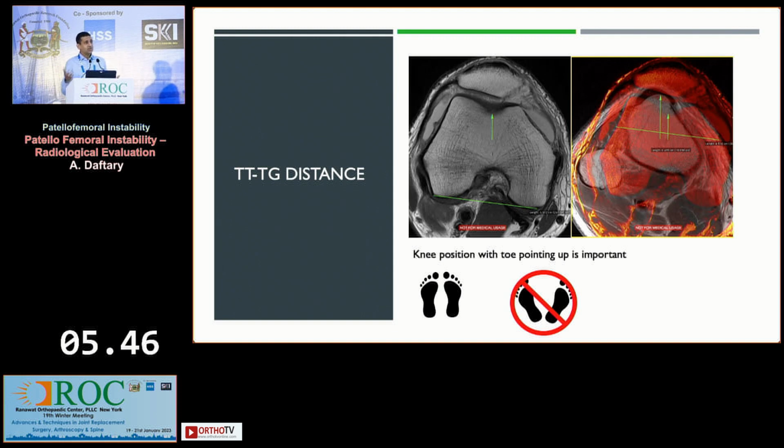And this would actually become far more relevant in people who have lax knees. Somebody who has a fairly solid knee, you probably wouldn't have much of a change. Somebody who has a lax knee, you would see a very significant change when you do and do not have packing, when you do and do not have degrees of flexion. So that variability is something you should be very aware of, and I think that's where your clinical intuition as to whether there is really an element of laxity or malrotation becomes very important.